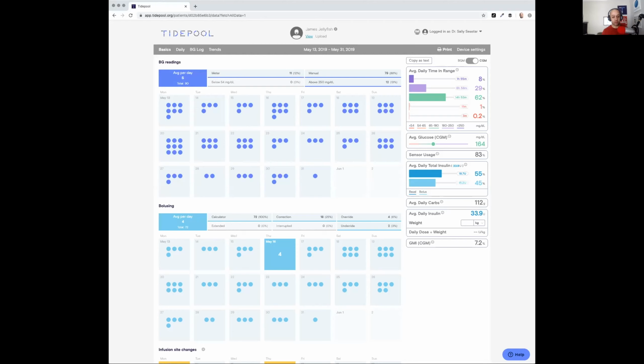So now let's take a quick look at what we've got going on here. I'm going to share my screen one more time. And now we have ourselves looking at our primary demo account, James Jellyfish. I'm going to work kind of quickly through some of these and just highlight some things that I think are important about each of the different views. If you would like a more detailed walkthrough of each of these different views within Tidepool, go to support.tidepool.org and you can actually search for any of the views within Tidepool Web, and there's a line-by-line breakdown of everything you see on the screen.